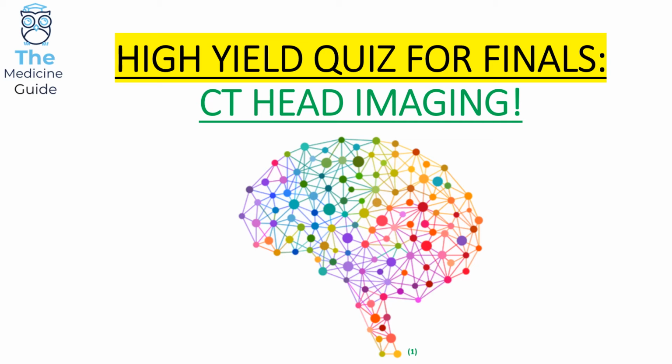Hello everybody, thank you for joining me today. In today's video we're going to be looking at the high yield CT head images that crop up time and time again for finals.